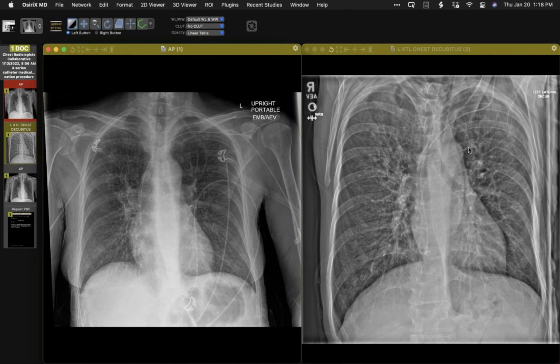So I said, okay, I can see the PICC, and perhaps not unexpectedly, given the change in the effective length of that vein and vascular structures with the patient in that position with the arm up, the catheter tip moves down because it's fixed at the arm. And yes, indeed, its tip is now located in the lower right atrium. Okay, so check this out.